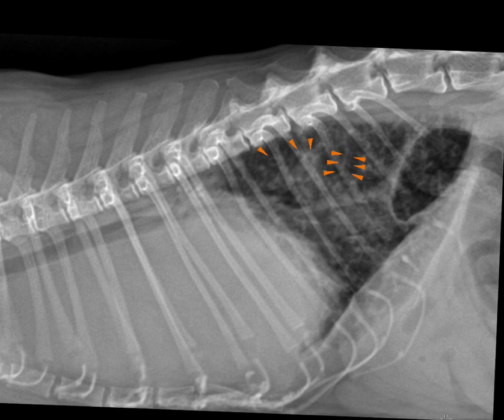The reality is that when we're radiographing, we just seem much more likely to catch end-on bronchi, creating rings or donuts, than we are to catch them in this kind of longitudinal plane, creating the railroad tracks. So don't be too put off if you see lots of rings and only a few lines.